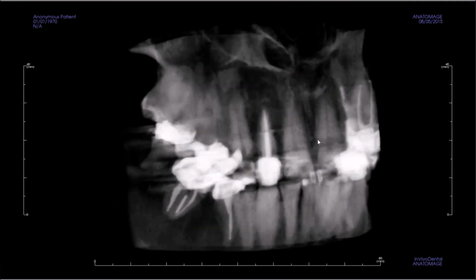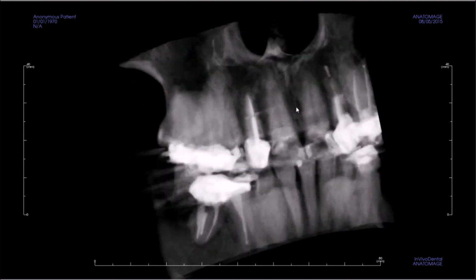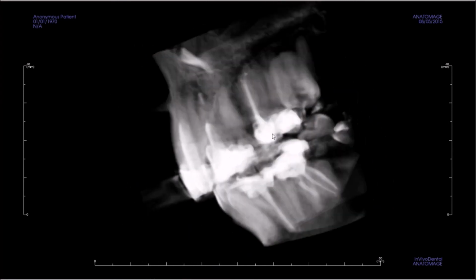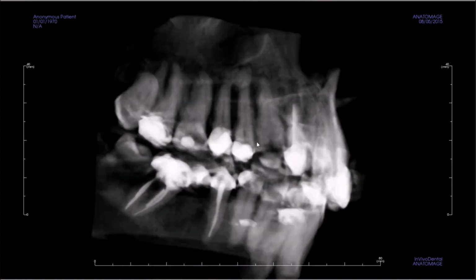Sometimes looking at the super ceph is helpful as well. But again, you can't see it in that much detail. Like the 3D view, this is just for getting an overview of the entire image.